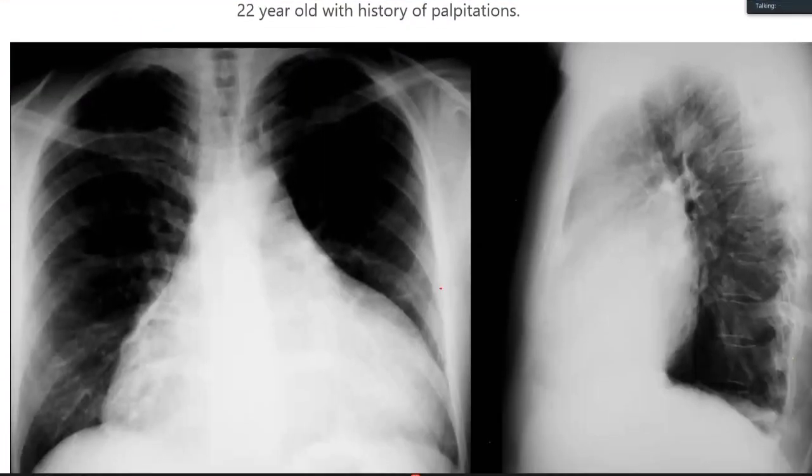Yes. Hello. I'm provided with X-ray frontal projection and lateral projection of a skeletally mature patient, in which I can appreciate that the cardiac size is enlarged. However, bilateral CP angles are clear. Bilateral lung fields appear normal. Trachea is central in position.